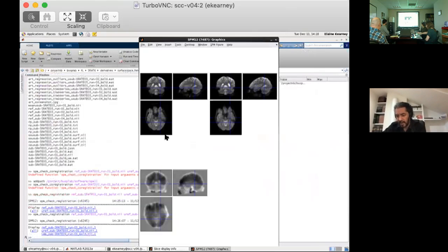Perhaps it might be worth trying the opposite directionality and seeing whether that gives us something better, because it is entirely possible that we are wrong. Remember, when we enter the blip, it's called VDM_blip field in the config files of the preprocessing pipeline. I think we enter the VDM, the echo time parameters, and I don't know if we leave the directionality at default or actually enter it in there. Could I look at one of your configuration files, if you don't mind? There is a -1 in there.